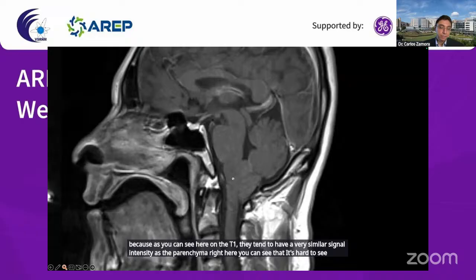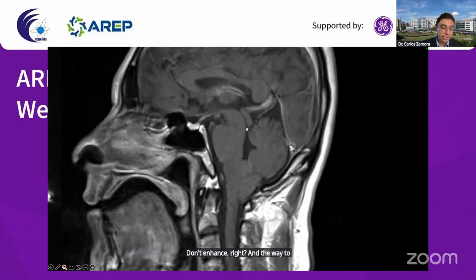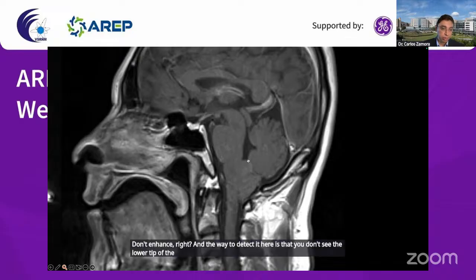Because most of them don't enhance, right? And the way to detect it here is that you don't see the lower tip of the fourth ventricle, right? It's just sort of blunted. So you have to suspect that there's something here.